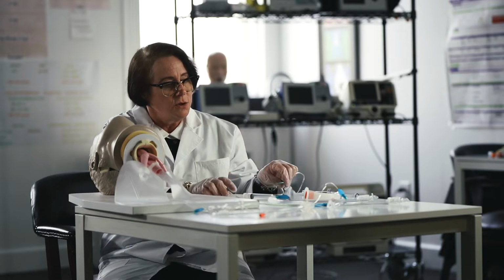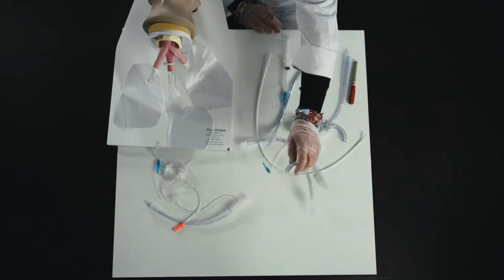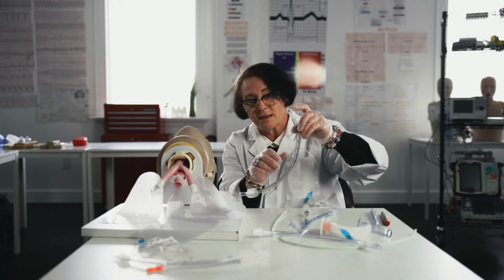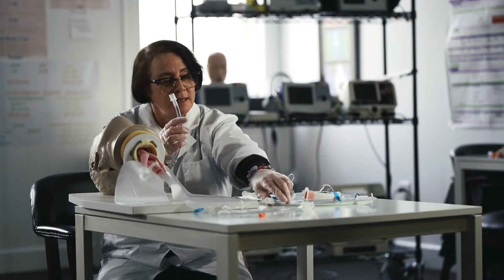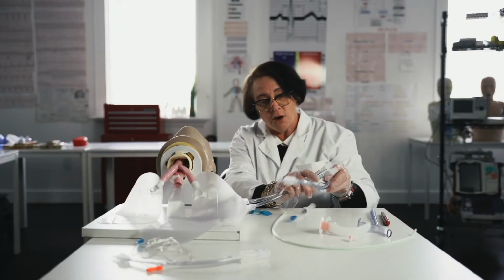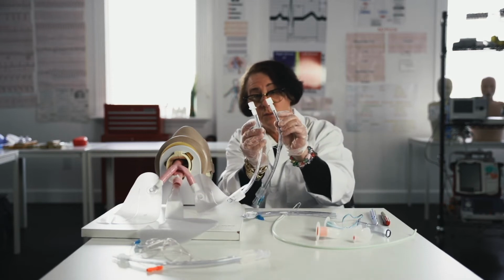Now, you're going to be using a bag valve mask, but it's not uncommon for anesthesia, paramedics, ER docs, intensivists to need to put in breathing tubes in your patients. So endotracheal tubes are very easy to understand. When you see an endotracheal tube, you'll see this white port. That's how you're going to hook it into your vent tubing and your bag valve mask. Right past that port is the size of the tube. This is an 8.0. This is very commonly placed in an adult male. And this is a 7.5, so that's in a larger size female. It's not uncommon for an adult female to be intubated with a 7.0 and an adult male with an 8.0.